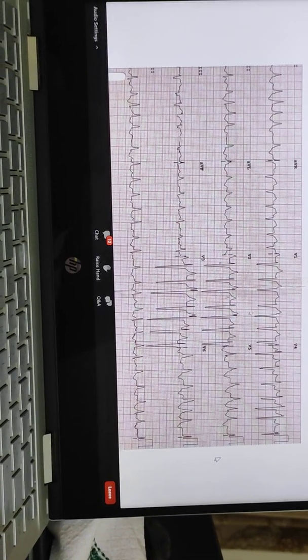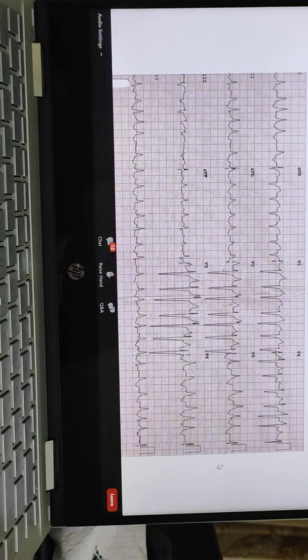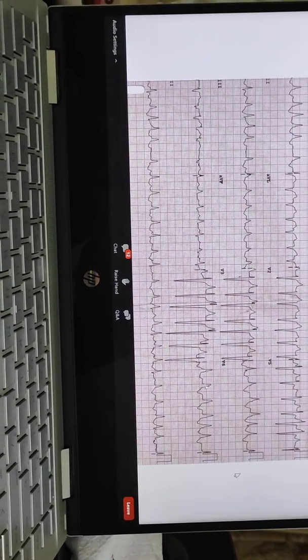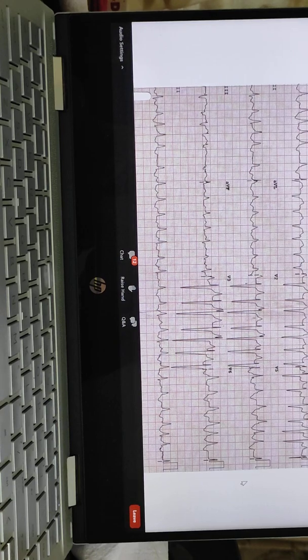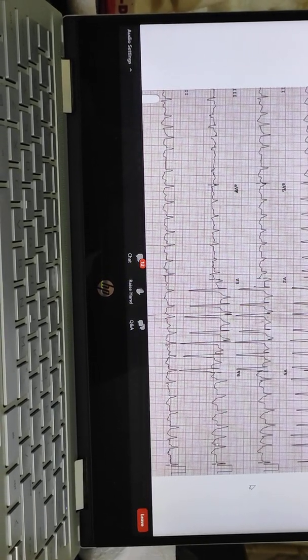Here the atrial fibrillation has happened in a patient who already had a left bundle branch block. As you can see, the wide QRS is because of the left bundle branch block, tall terminal positivity in V5, V6 and negativity in V1. In a given single lead, V6, you see the QRS complexes look exactly the same.